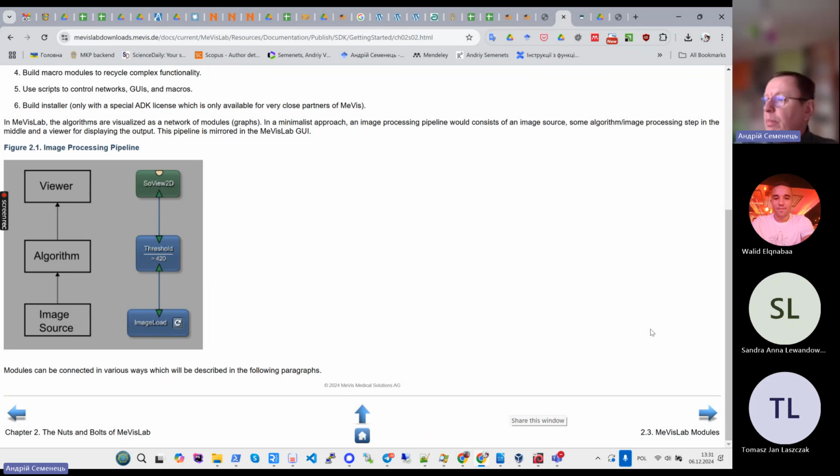All operations in MevisLab are bundled into so-called blocks, and each block performs one major operation and has some additional extra features. When you want to do something, you assemble a mesh consisting of the necessary blocks, join those blocks with data transmission lines, those arrow lines, and you will get what you need.